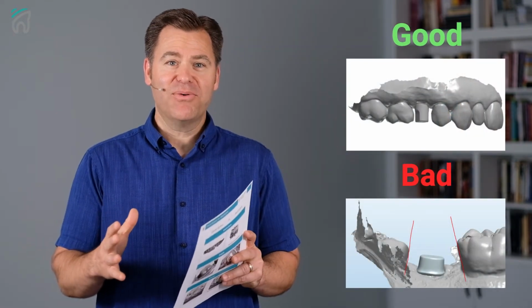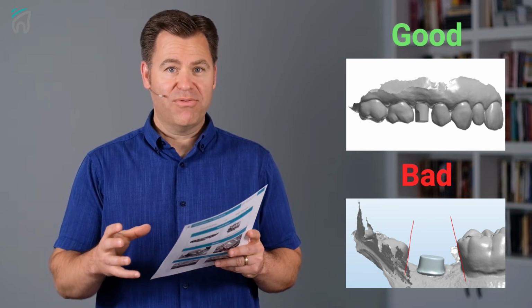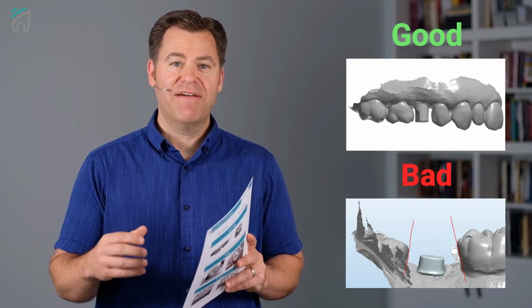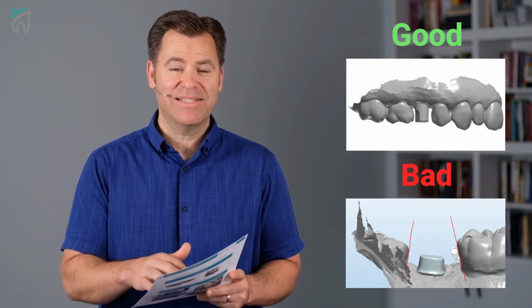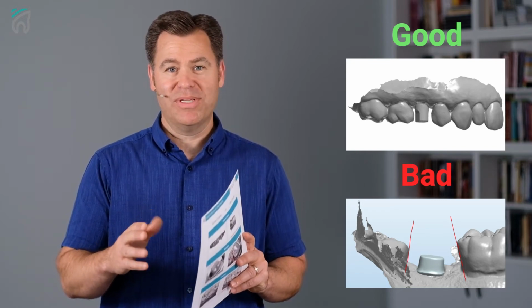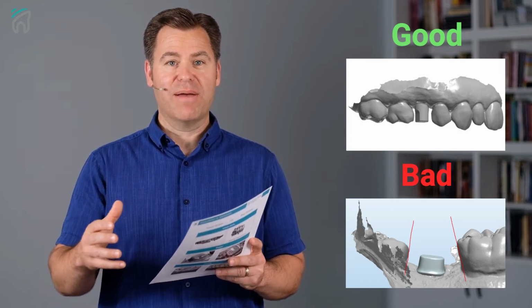And the next one is also the contacts, but the draw of the contacts. This is one that I'm particularly passionate about because I think it'll really help you and help your patients. One of the areas that's really important in the mouth for restoration, as you know, are the breadth of those contacts and having the right kind of gingival embrasures to avoid food traps. So we show you pictures of implant scan bodies because we actually see this on implant cases most often, where the angle of the contacts doesn't help us, number one, get the crown seated, but it also then opens up embrasures and causes food traps. So just watch for that.